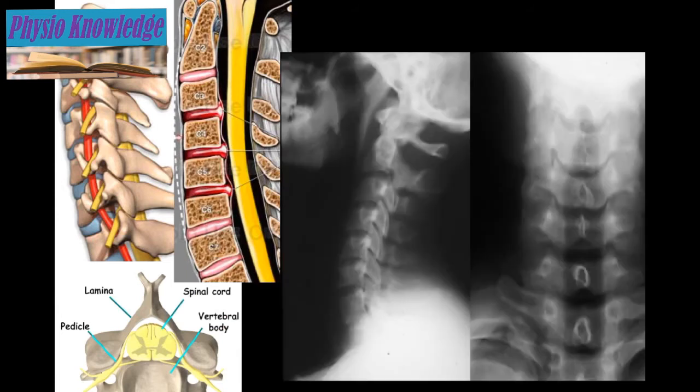So in this example, what I'm showing you is now the neural foramina, or the schematic of the artery in which you would have the vertebral artery going through the cervical spine. You have the spinal cord and the neural foramina, which all play a role in our assessment of the spine, especially in the setting of trauma. In the image in the bottom left corner, you have the lamina, which is what we remove when we do a laminectomy for a neurosurgical procedure. Then the patient has surgery at this point.